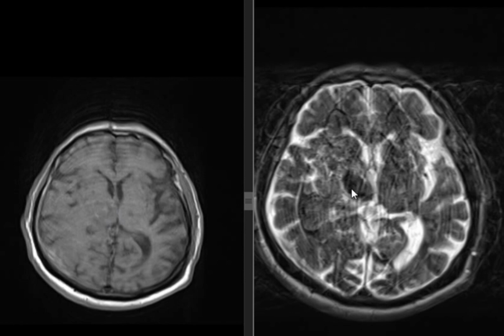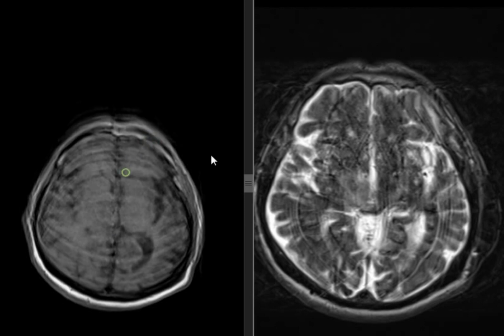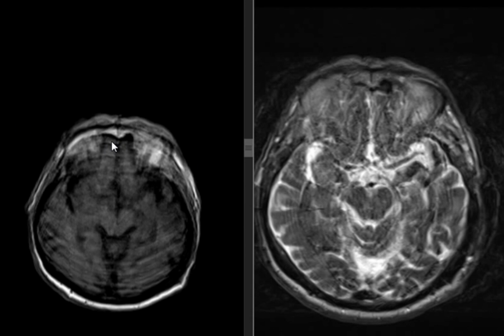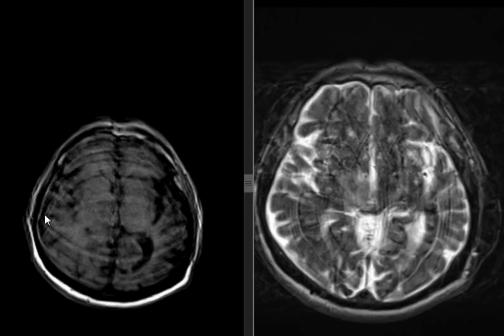Iso? Dark. Let's do a little bit of manipulation and see even better, because the motion artifact is there. It's dark. What's the dark? Chronic, it's a chronic one. So which one is the cause of his disorientation? The new one. This is an old one. It doesn't matter.